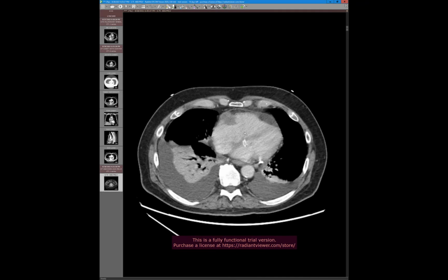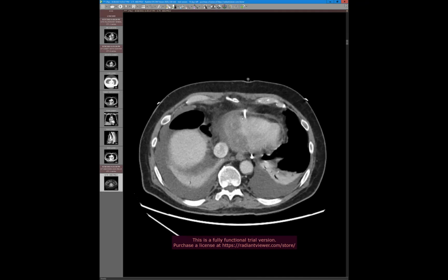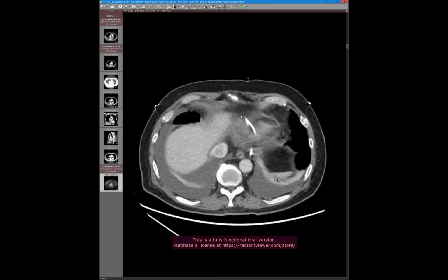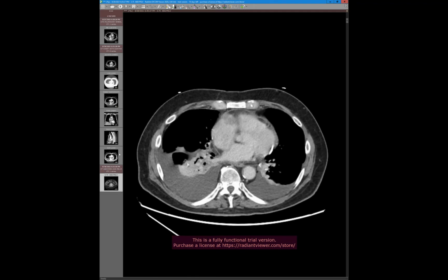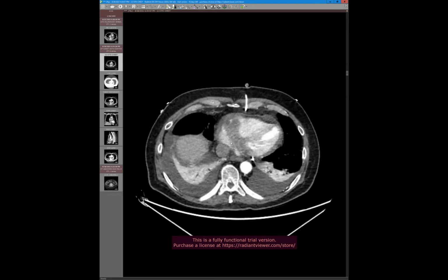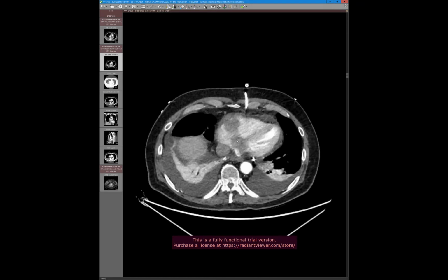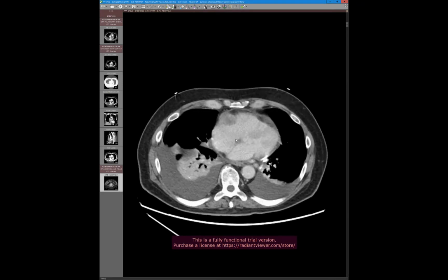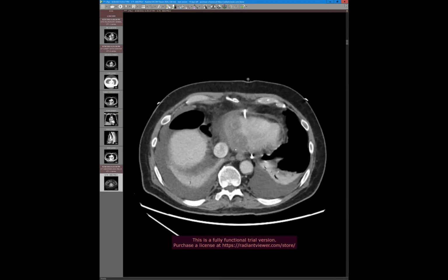You know, these are always better seen on portal venous phase imaging, which we often don't get because we do most of our studies at 100 kV, and our body folks refuse to scan anything other than 120 kV. So whenever there's a difference, we get the arterial phase, they get the portal venous phase.